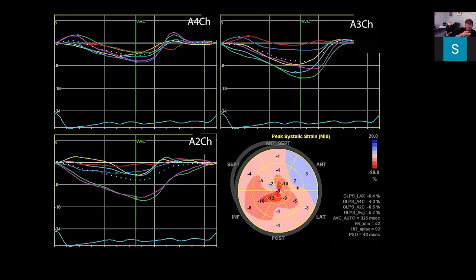So there's regional abnormalities there. Most obvious is the anterior wall looks dyskinetic. So here we've got 3. So 3 is blue, that means dyskinetic. You can see the scale up here. The basal segments predominantly, and some of the mid segments also show severe impairment.